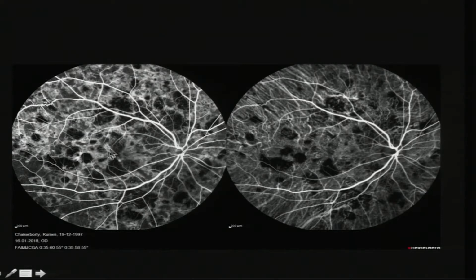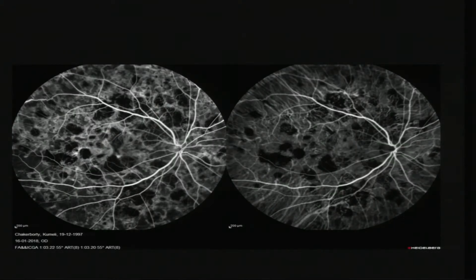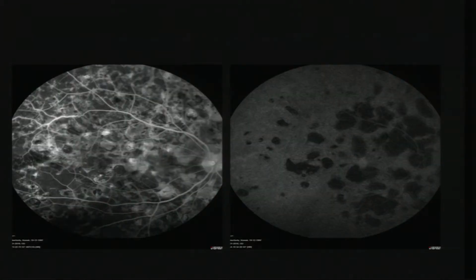We did not see a very clear-cut network that could be suggestive that there is an underlying choroidal neovascular membrane. And this is the late phase, except for this dot, which was coming in the late phase as hyperfluorescent. We normally did not see anything on fluorescein. And on ICG, we did see some hyperfluorescence here, but again, we did not see that classic network.